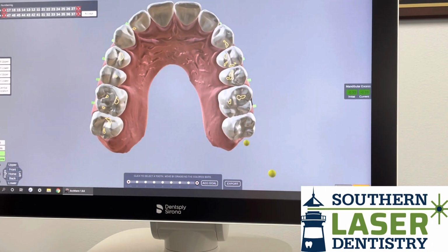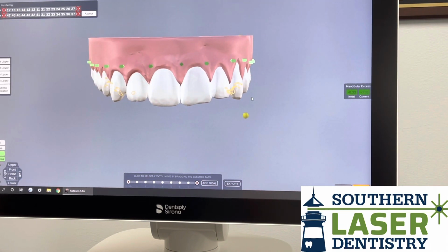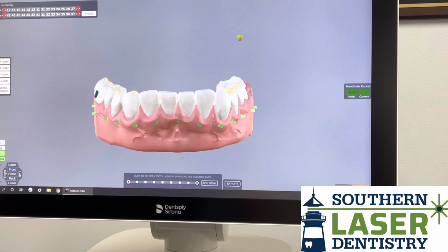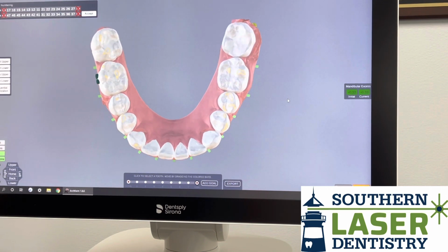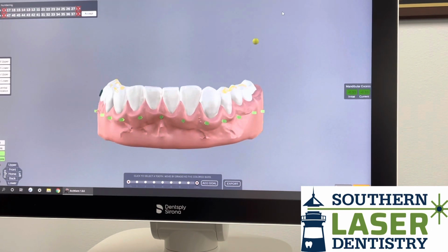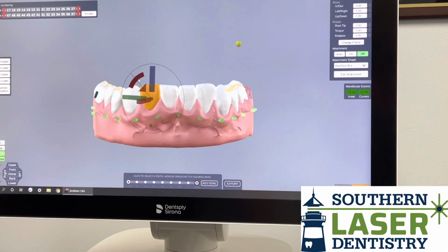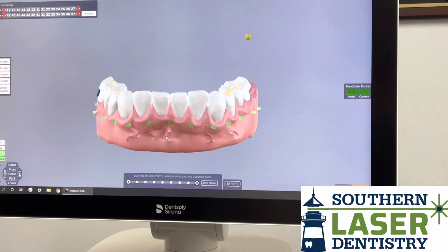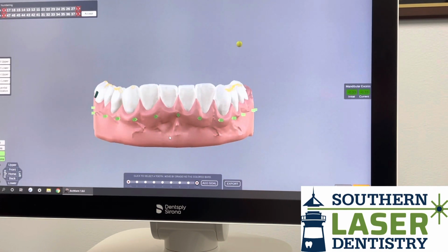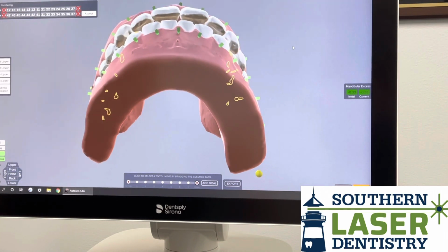And we're not really changing anything with the teeth that we're moving here. Now his top teeth are looking pretty good, so I'm going to the bottom here. And there really was almost nothing to do on the bottom. I mean, he didn't even mention his bottom, but as I looked at it further, I saw that this one tooth, we could probably tilt it a little bit, and you see the red show up there briefly, and then I was able to slide the tooth over to the side a little bit and make that red go away, so we know there's no interference. Just doing our final check here.